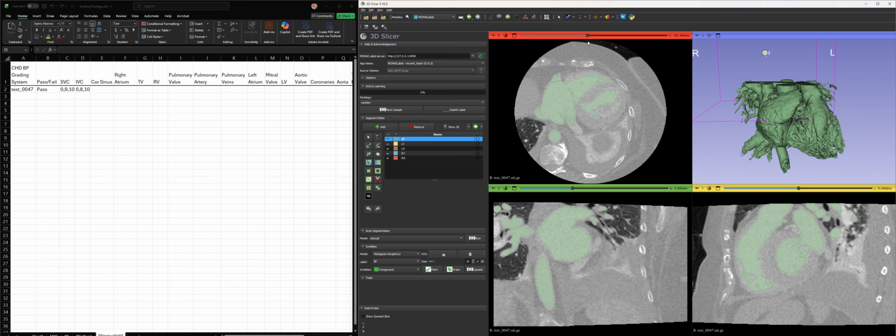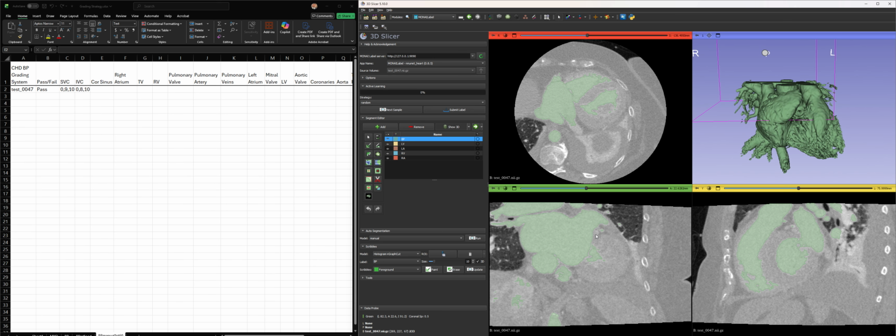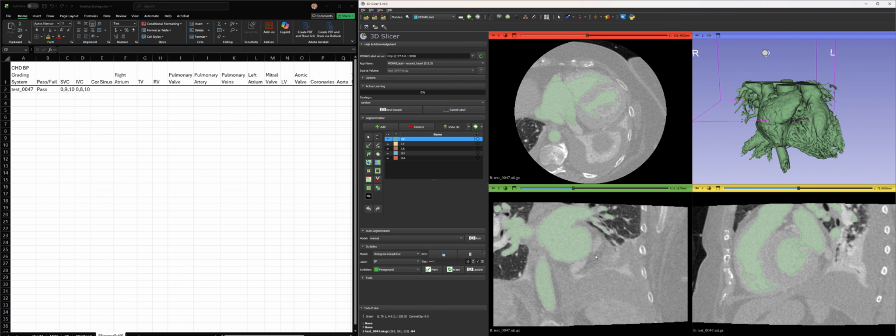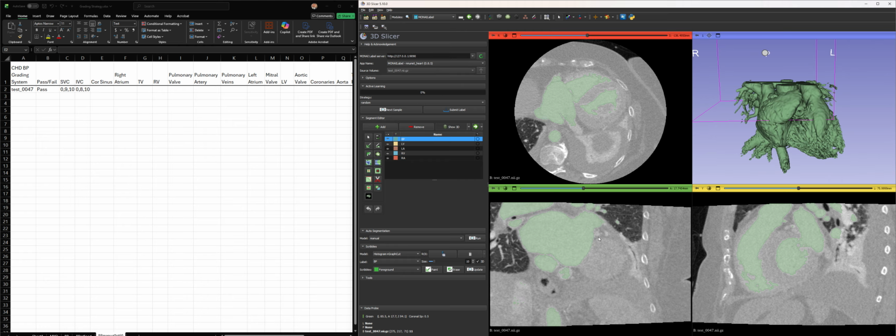And the thing I was going to say, it dilates out way up here, and then it starts to diminish here. So when I'm saying how far would I go with this, because it's dilated, I can see it a lot further. So I would say what is a perfect 10? It would be if it was all the way over to here. But once it gets up higher there, I'm not worried about it.